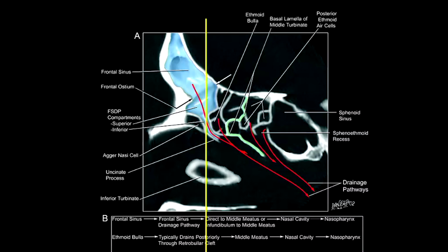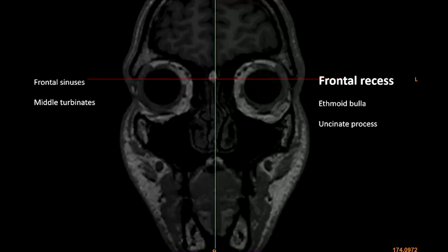and now we're going towards where the frontal sinus drains into the nasal cavity. That's that really narrow area. It's really hard to see on this, in this room on the screen. But okay, so this is the uncinate process, and normally you would see it because I think it's blown up, so it's quite pixelated. But it was going towards the orbit, which meant that the frontal sinuses were draining into here. And you can see on the other side, you've got the uncinate process. You can see the middle turbinates, vertical.